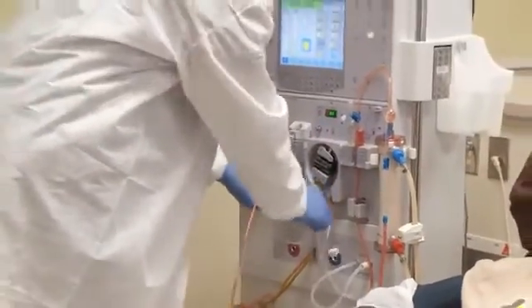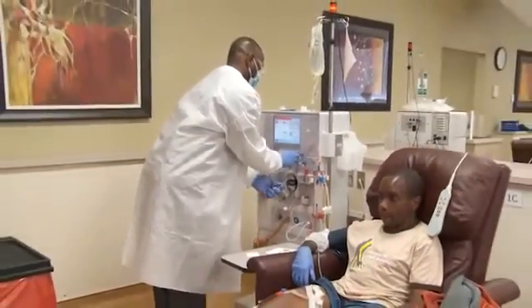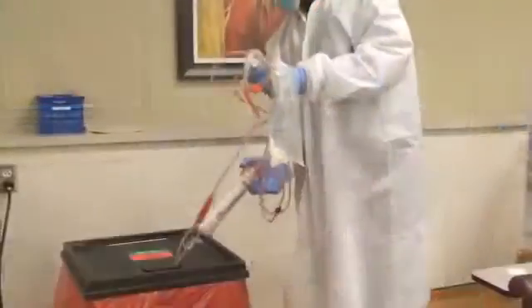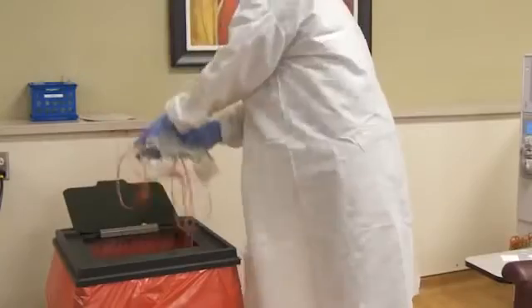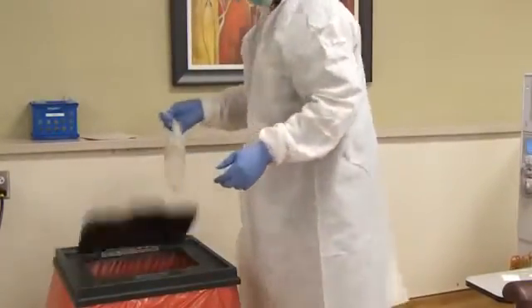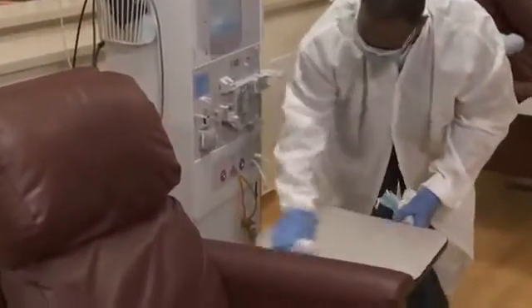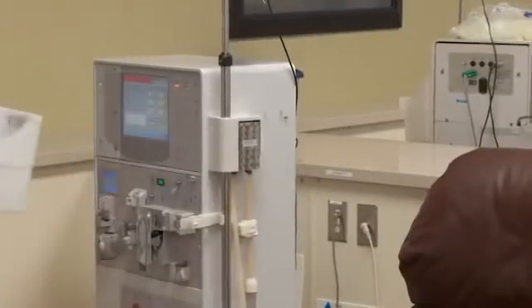While wearing a gown and gloves, disconnect and take down the used blood tubing and dialyzer from the dialysis machine. Discard tubing and dialyzers in a leak-proof container, or remove the dialyzer from the station in a leak-proof manner. And check for visible soil or blood on surfaces. All visible blood should be cleaned immediately. The following actions may be performed in any order.